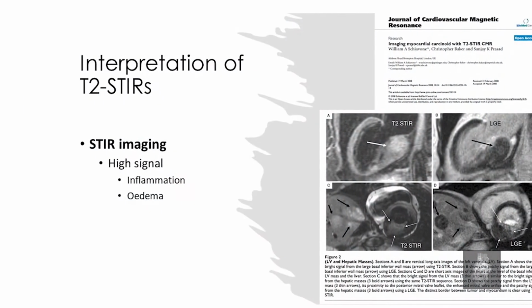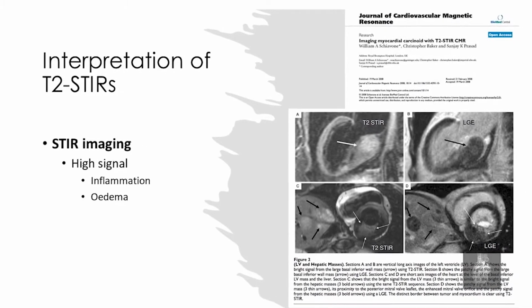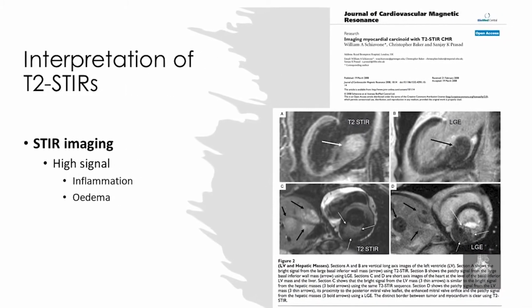As we saw earlier on, there is a long list of Class 1 indications for CMR in acquired diseases of the vasculature. T2 weighted STIR images are ideally evaluated side by side with images acquired post-gadolinium contrast. High signal intensity on STIR sequences indicates a high water content that suggests active inflammation and/or edema.